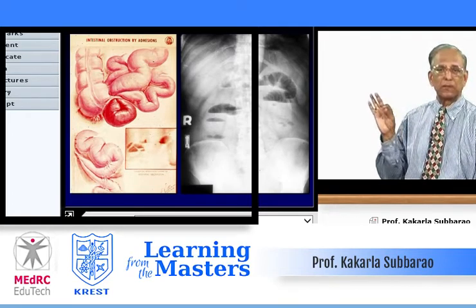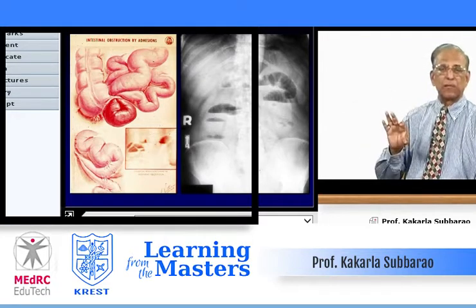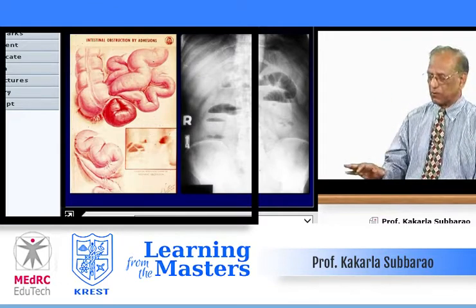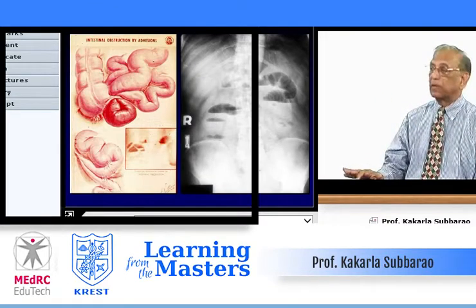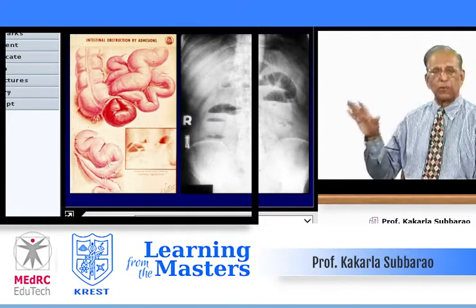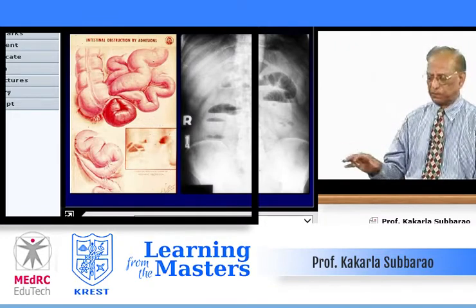Look for the stomach. Stomach is distended in paralytic ileus. Colon is also distended in paralytic ileus. And then small bowel distension with air fluid levels. This is a case of perforated appendix with paralytic ileus simulating small bowel obstruction. But then maybe perforated appendix formed a localized abscess and producing really partial obstruction of the terminal ileum.